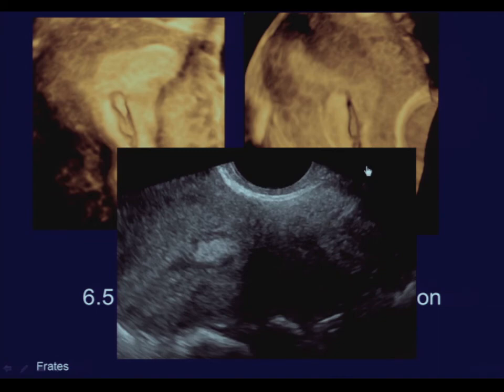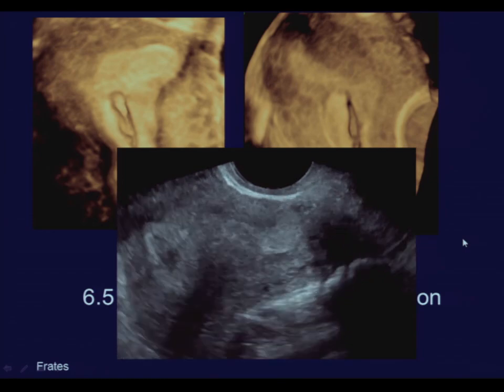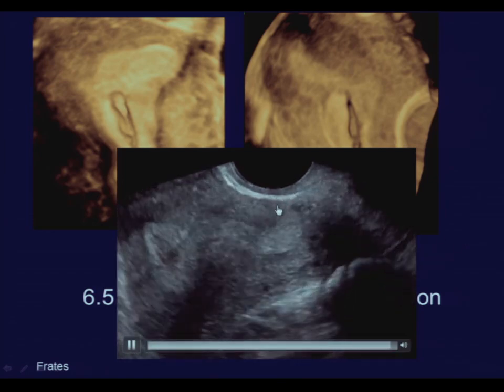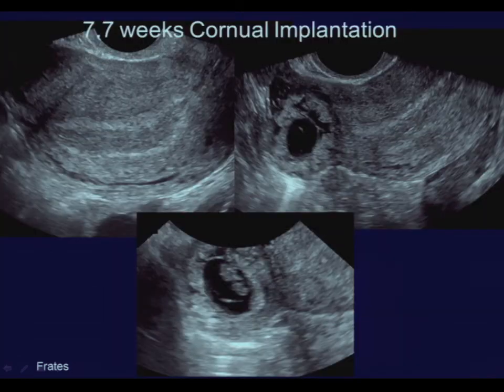And again, the follow-up grayscale was just as diagnostic, with the sac starting to climb higher up into the uterus and myometrium preserved in the region of the C-section scar. What about cornual implantations? Can 3D rendering help us with cornuals?